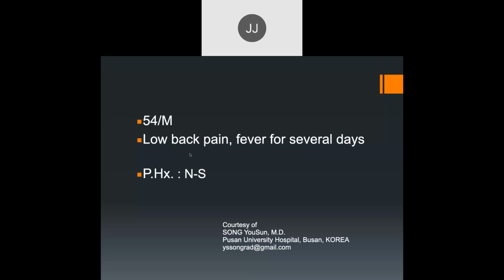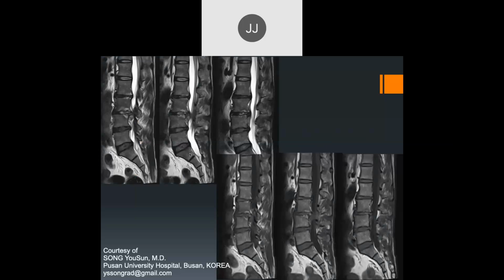So, Payson, what do you think of this one? All right, 54-year-old male, low back pain and fever for several days. Okay, we're looking at the L3-4 disc space there. There's some abnormal signal within the intervertebral disc and some end plate edema. And it looks like there's some extension into that extradural space anteriorly.